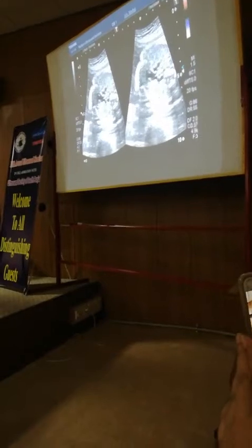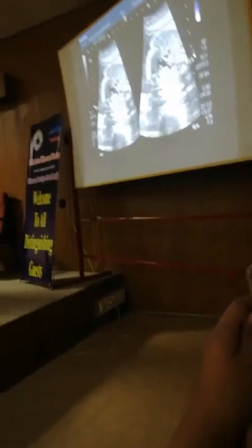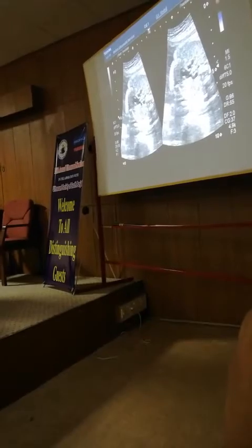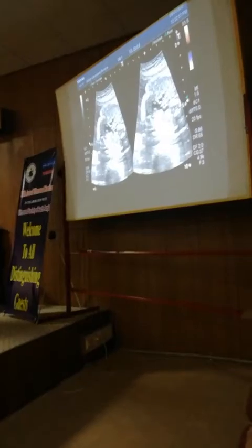Look deep, seeing the ductus arteriosus. हम लोग imagine करते हैं ductus arteriosus सबको नहीं नजर आती. Wow! So somebody seeing the ductus arteriosus and writing patent ductus arteriosus. No, it's not a big deal.